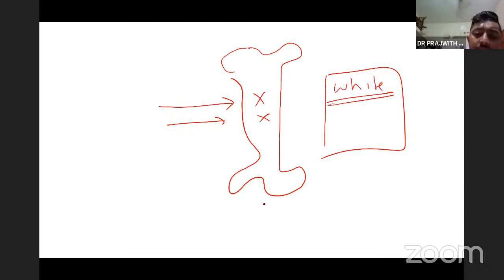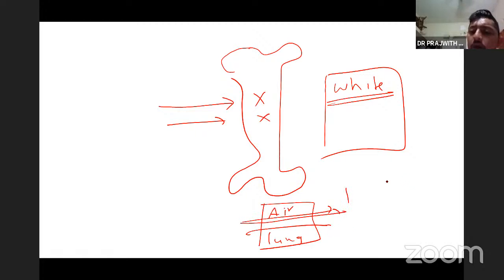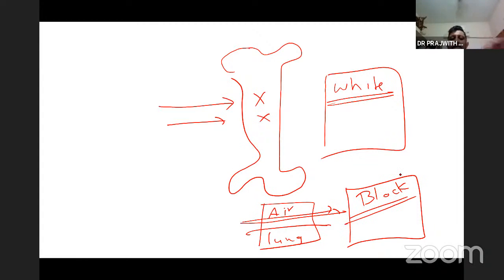Now, when we see the lung, which is filled with air, it will allow most of the X-rays to pass through it. So it will turn the film more black. So this is what we have to remember. Anything that allows the X-ray to pass through it will turn the film blacker. Anything which will stop the X-rays from passing through it will turn the film white in color.